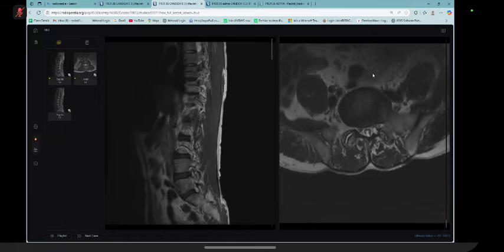side, and then you could have checked all the left sides, picked this up and said, my final diagnosis is left-sided facet arthropathy at L4-5 level, and there is a synovial cyst or ganglion cyst coming out of it, compressing the left traversing nerve root. I would like to correlate it with the clinical findings, whether it is affecting the thigh or calf region on the left side.